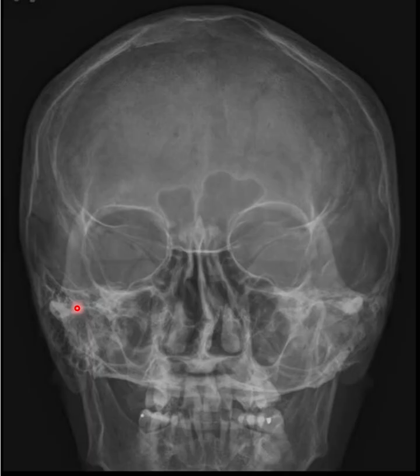Excessive, more than 15-degree caudal angle would cause the petrous ridges to be projected lower than the orbit. So, just wanted to identify that for you, that this is not an optimal diagnostic quality PA Caldwell Skull X-ray as far as we learn the criteria. So the petrous ridges should be in lower 1/3 of the orbit.